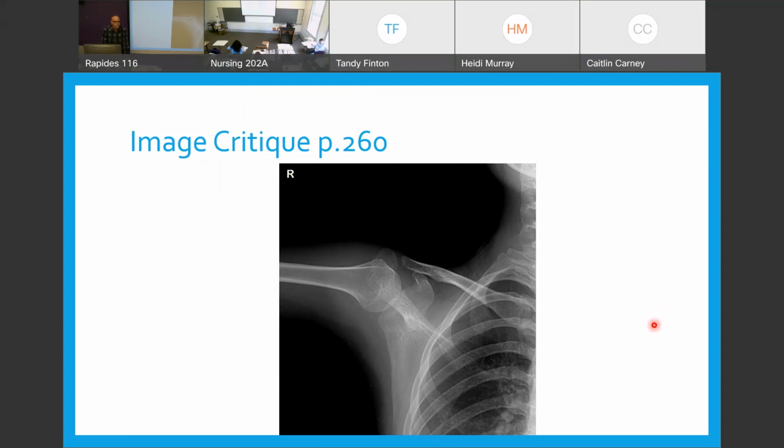Okay, you said you think it's a shoulder joint, and the arm is where? Do we do shoulders this way? Oh no. Again, follow the humerus on out. Do your arm like that. We know it's going that far out. Do we do that for any shoulder?